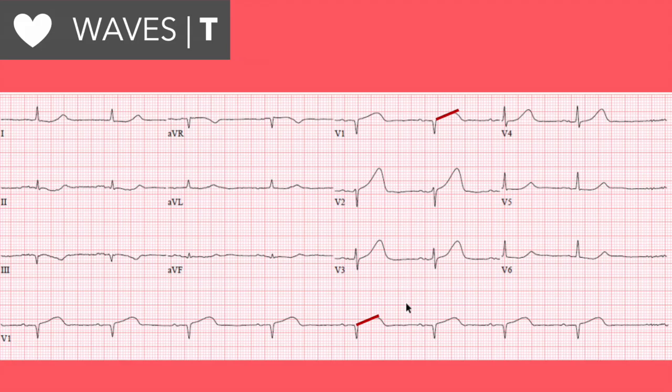Now this T wave in V1 is also pretty concerning because it's getting straight. This is the straightening of the upslope of the T wave, a hyperacute T wave. Maybe V2 and V3 are trying to get straighter too. We gotta repeat some ECGs to find out more.